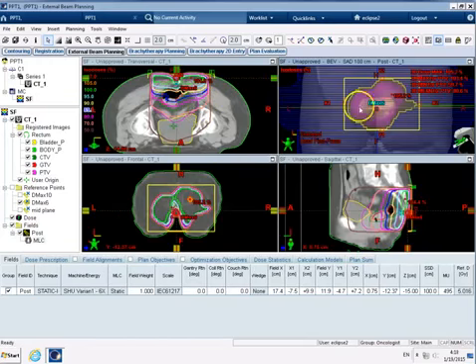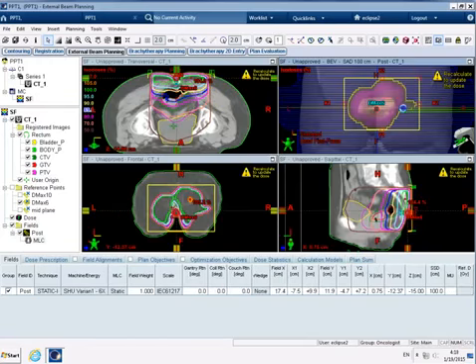Okay, so what we need to do is work our way up and down the patient, optimizing those leaves in order to make them, as I say, about 0.5 does the job roughly, but then often you have to tweak from that point onwards. Okay, so we can optimize our field. So hit pause now and spend a little time optimizing the field so that this high dose region is clipping the edge of the PTV either side.